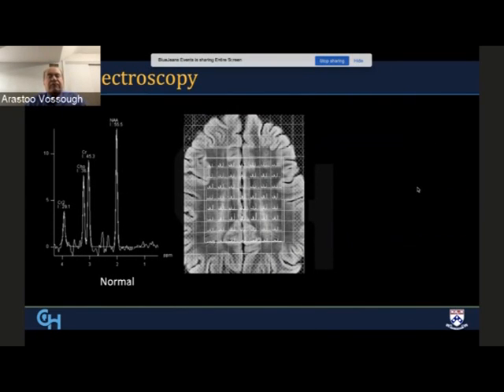Another study that is often requested is MR spectroscopy in patients with white matter disease or suspicion of white matter disease. So this is a normal spectrum. We have the major spectra. This is a clinically acquired spectrum. We have N-acetyl aspartate, a neuronal marker, and choline, a so-called cell turnover marker, and this is the general relation that they have and ratios with respect to each other.